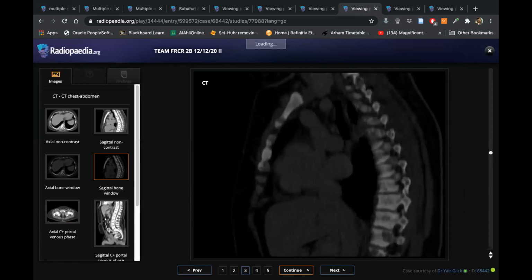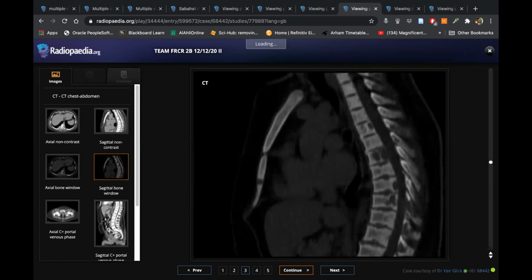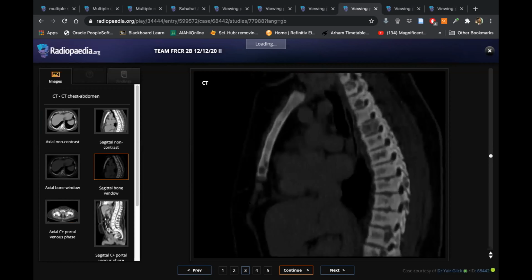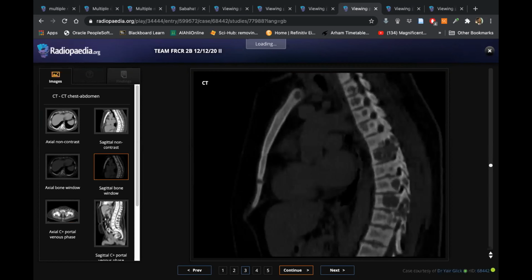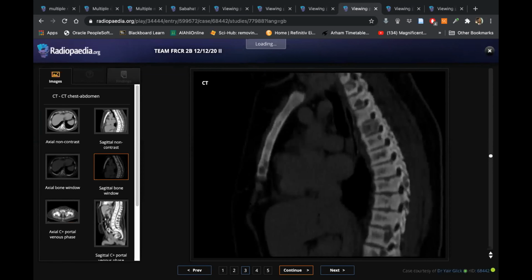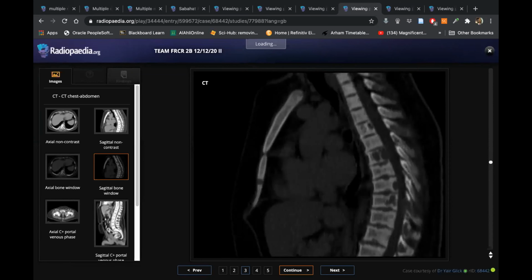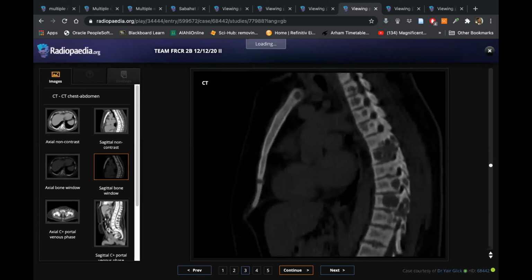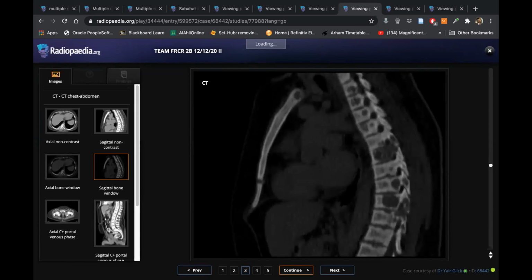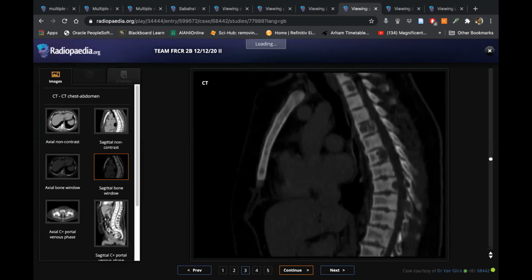Have a look at the bone windows. Yeah, these could be the multiple brown tumors within the bones. Okay. Do you feel concerned with these brown tumors? The pattern? Yes, as some of them are seen in the posterior vertebral elements and within the vertebral bodies compressing the spinal canal and could have a compression effect over the cord. So I will immediately refer the patient for a neurosurgical consult and advise the MRI.